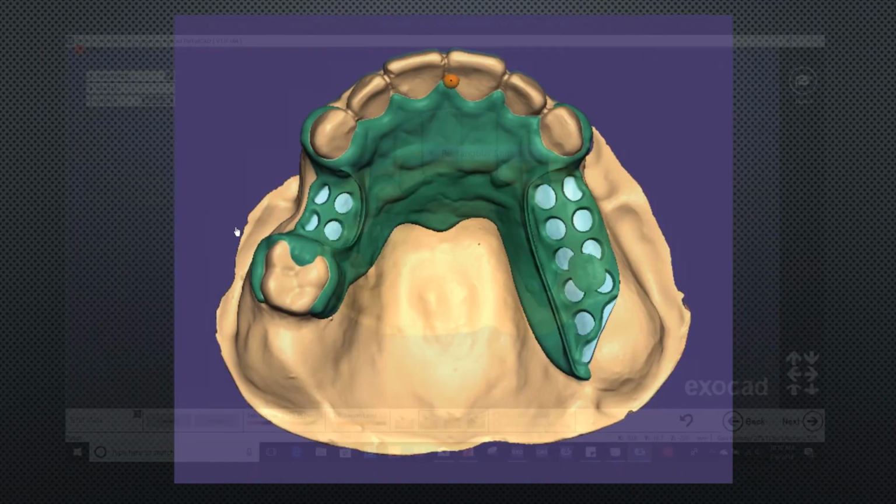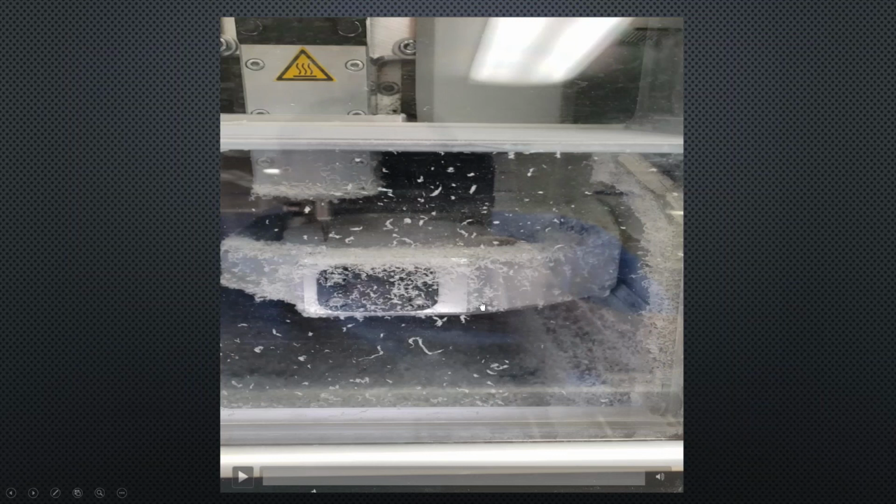One thing that I would like to show in this video, so this is just a video of a VisiClear being milled, is you can look here, it mills beautifully, never clogs up a burr, it mills just like butter. I think it mills a little bit nicer than even PMMA, but you'll see it's a little chunky. The chunks of material it brings off are a little bit bigger.